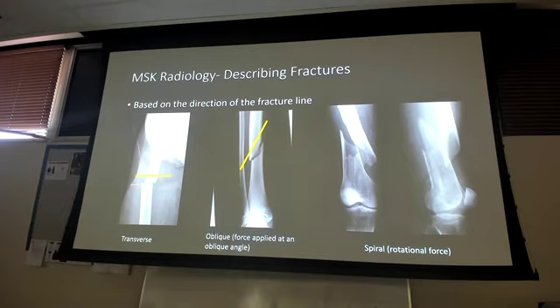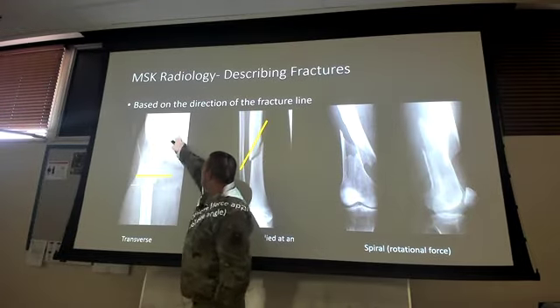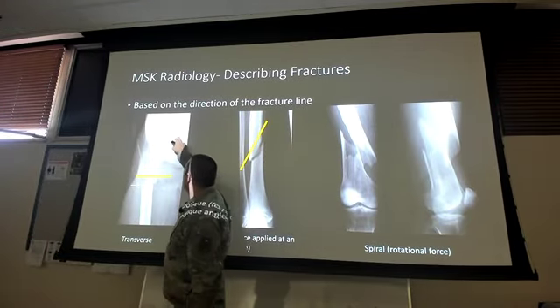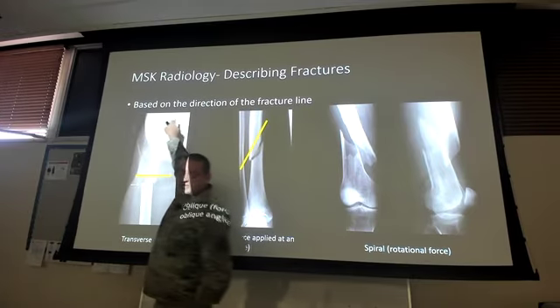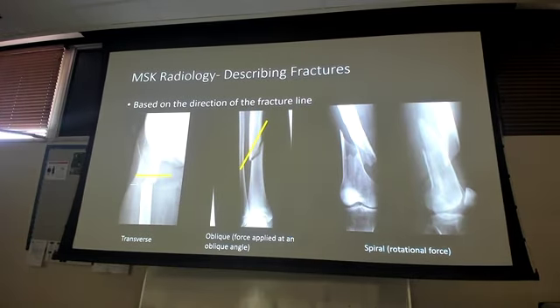So now, if I look at it as if pretending the whole pelvis is there, my left is the patient's right. My right is the one that's missing, that's the patient's left. So that's how I know this is a right femur and a right hip, because I have the context clues of my pubic rami, my ischium coming down here, the femoral head going in medially, the way the pelvis is set up.